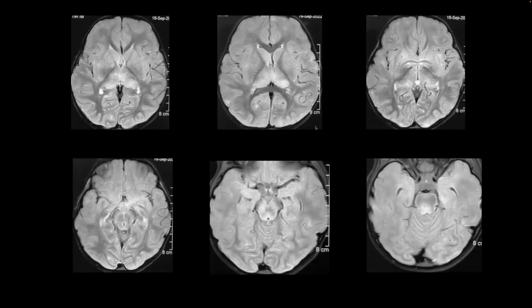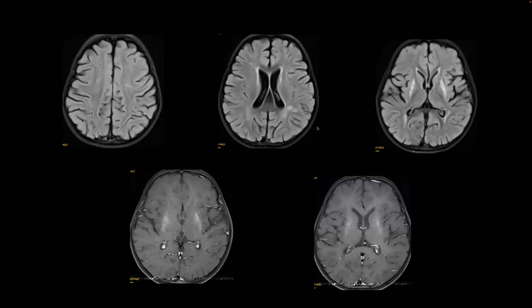So these were the only images I had, so I'm not sure of the extent of the new lesions and old lesions. I didn't have a diffusion. So there was no diffusion restriction. These were the only lesions. I can say maybe the periventricular white matter, but the thalamic ones have improved. They're almost completely resolved. But these putamen atrophic gliotic changes, are these new? I don't think they are new. I think these are more chronic changes, but they are rather symmetrical and showing gliosis, necrosis with gliosis. But these are not new changes, radiologically.